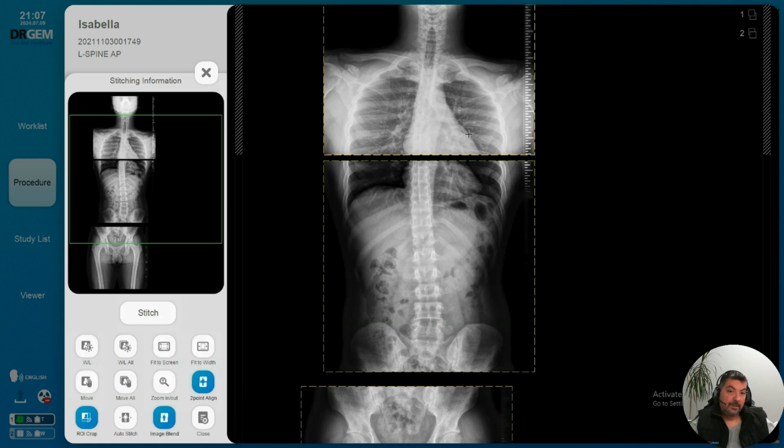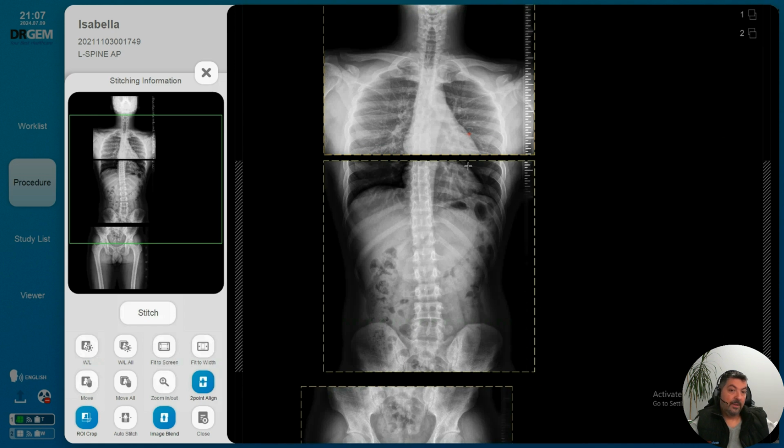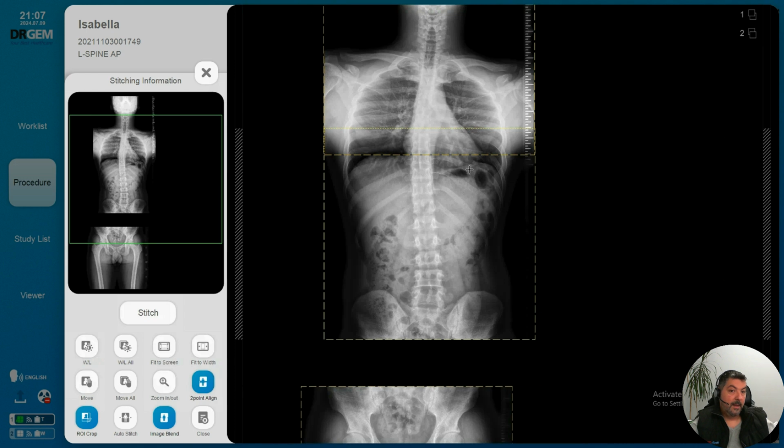So I'm going to use the corner here. I'm going to click on this particular corner right there, and I can see an identical point right here. So I'm going to click on that as well. And what that will do is align those 2 points together, or essentially align the second point to your first reference point. So watch what happens when I left click. It automatically pushes that image up. Now, you can use this move icon if you're not happy with it, or you feel the need to move it a little bit up or a little bit down, or to your left or to your right. You've got that in place. You're happy with the image. Now it's time to move on to the second one.